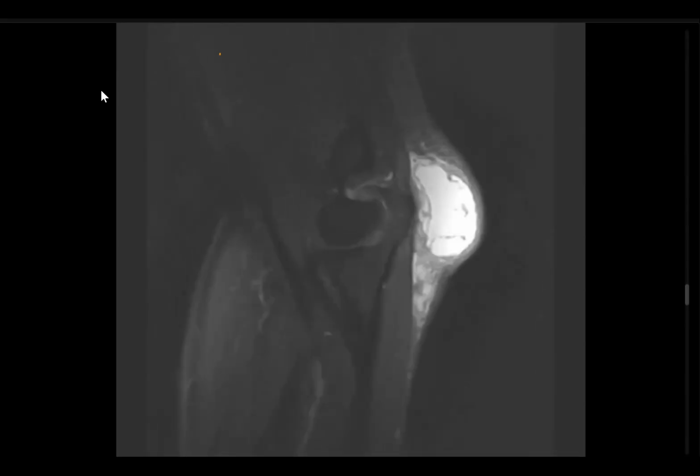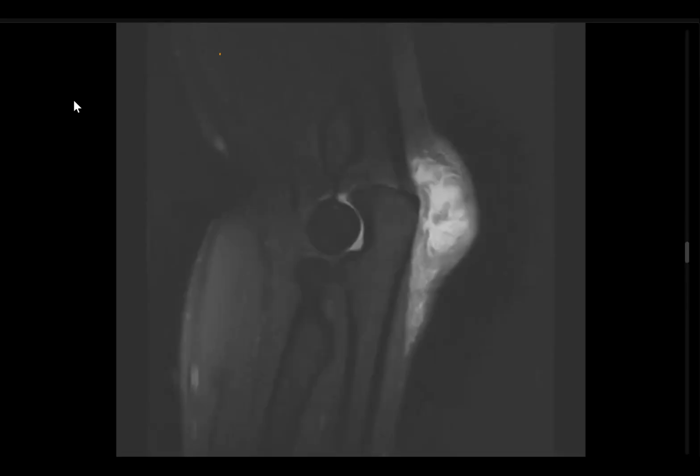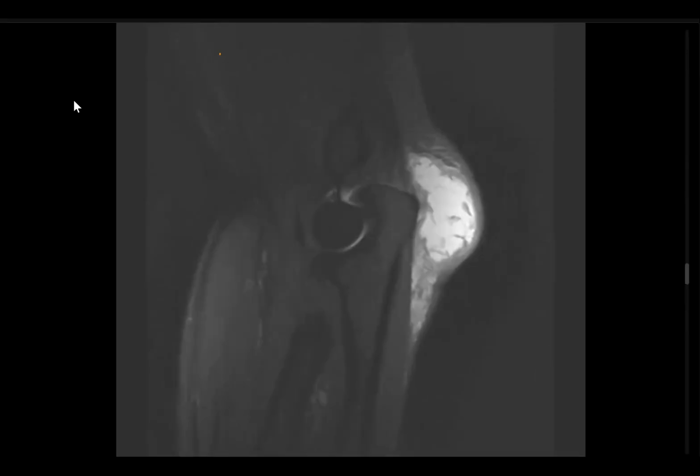Okay, I will start with you, this group of images. The patient has pain and swelling. This is an MRI of the elbow, showing evidence of a hyperintense lesion at the posterior aspect of the elbow in a subcutaneous location. I cannot see any bony erosion associated with it. However, there is mild joint effusion noted.